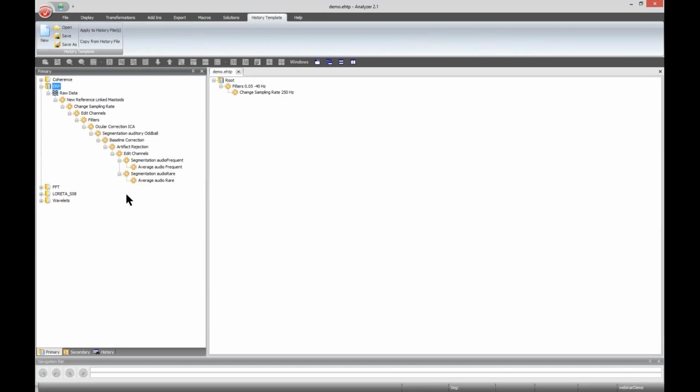Shown here is an ERP processing pipeline for an oddball paradigm. Let me quickly walk you through it by mentioning the most critical points. After pre-processing, including filtering and also getting rid of EEG artifacts by ocular correction ICA, the continuous data is segmented to all conditions included for the auditory oddball task. Data is then baseline corrected and once more artifact rejected.